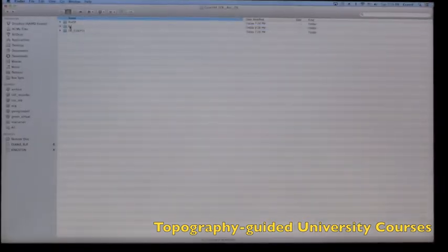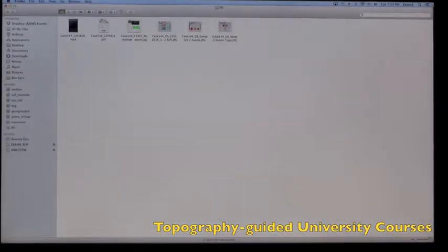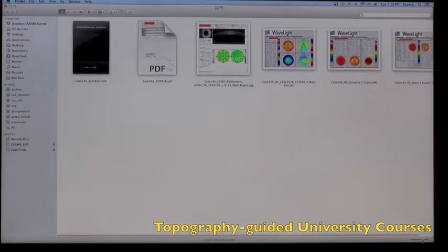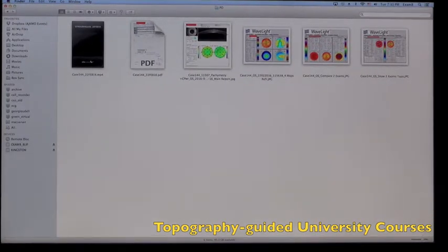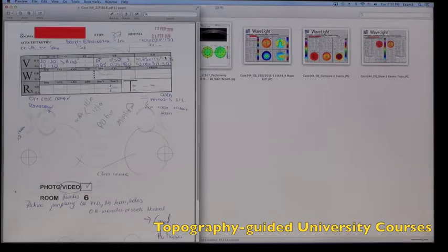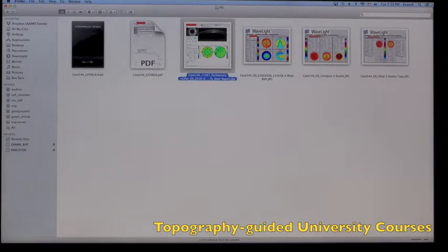So in each given case, we also have the post-op data here. Let's zoom on these pictures where we have the final refraction, which is our flow sheet. Let's click on that. And then we have an OCT map of the cornea thickness and the epithelium of the cornea.